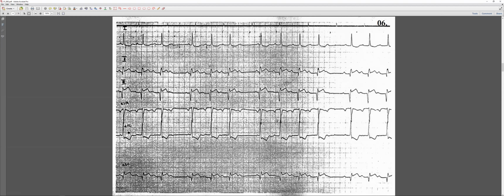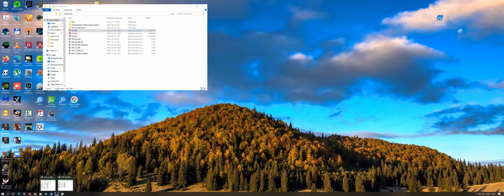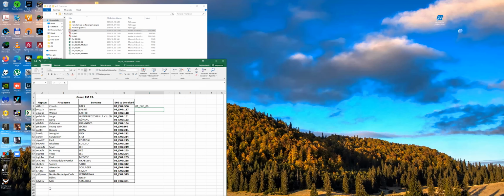Okay, well. It's not so fluent, but I can offer a mark of 4, but you can do it later on again. Okay. Did I miss anything on the ECG? No, nothing. It's okay, but you still need a little practicing. Okay, thank you very much. That's okay. No problem.